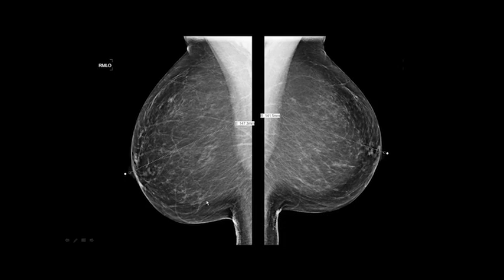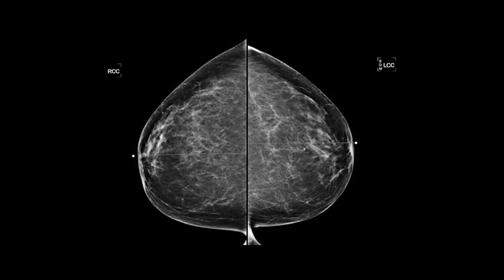Now on the MLO views, they're absolutely beautiful. Of course, this is a fatty case. She's entirely fatty. The muscle's wide with the convex border down to the level of the nipple. On both sides, it's beautiful. The IMFs are beautiful, open, without folds. The bottom of the breast is horizontal. The nipples are in profile, and there's no folds up here. So these are absolutely beautiful. I can see why they turned these in for the ACR, but it did fail in measurement.